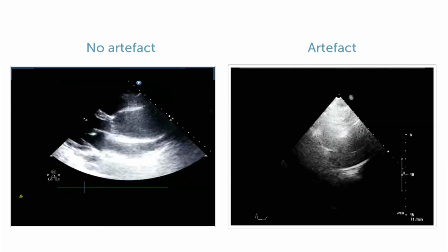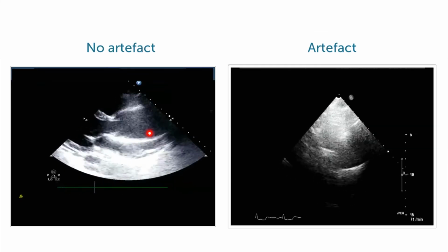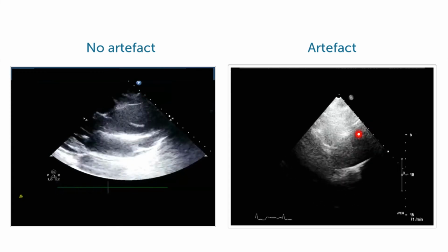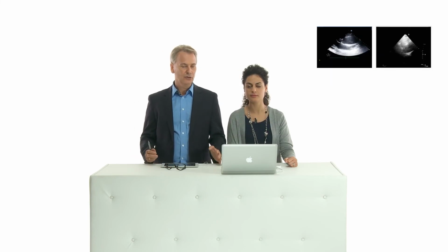And for comparison purposes, look at the motion of this dissection membrane here, which moves kind of awkwardly and kind of desynchronous to the anterior wall. This is not the case here. So you could easily mistake a patient for having a dissection if you don't look into this finding.